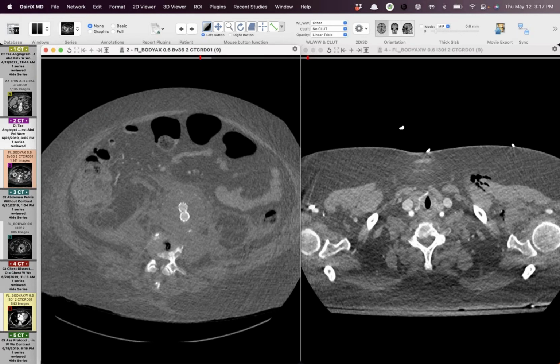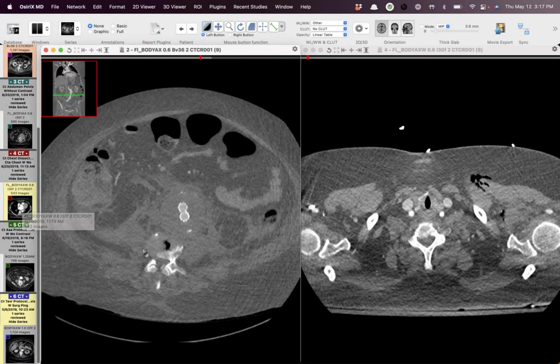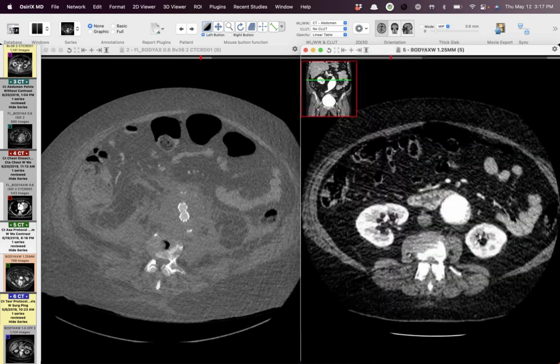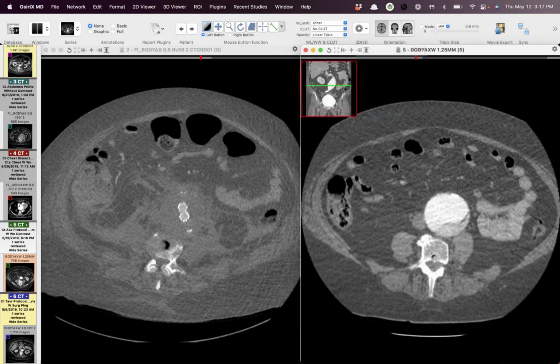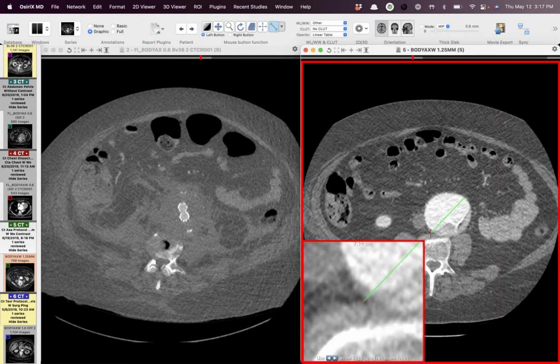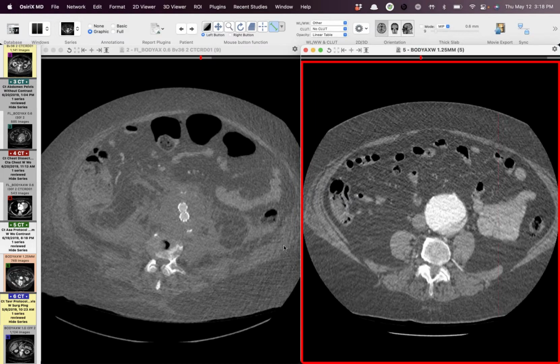I don't think I've actually seen an abdominal aortic dissection before lead to rupture like this in the setting of a AAA. Usually AAA is just rupture. But even on this CT right here, there was no real sign that rupture was impending, even though it is pretty large at that point in time. So just kind of an interesting case that could be an entire lecture in itself on vascular processes, because it was over 7 centimeters there.